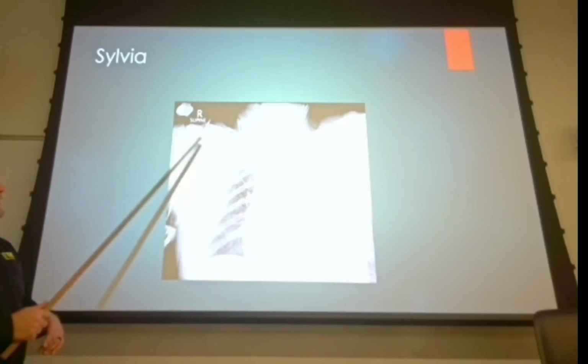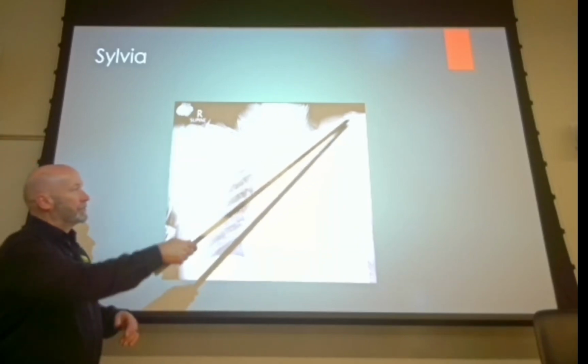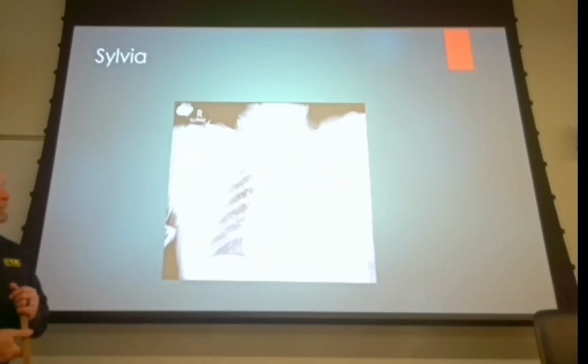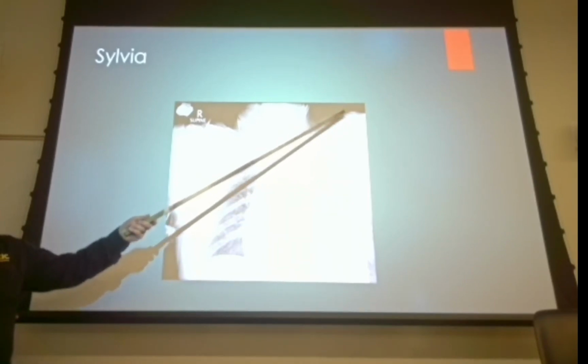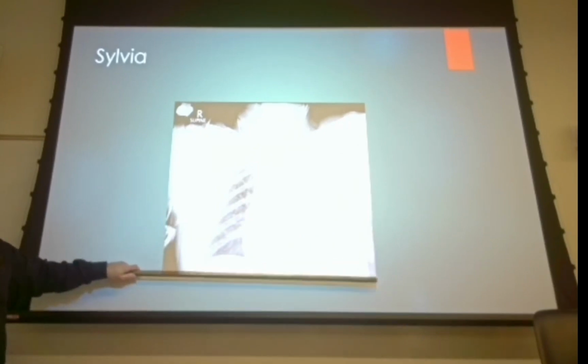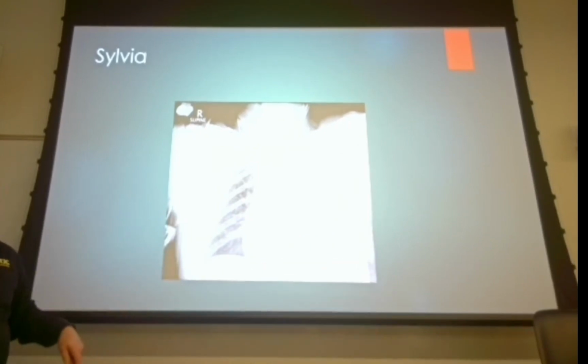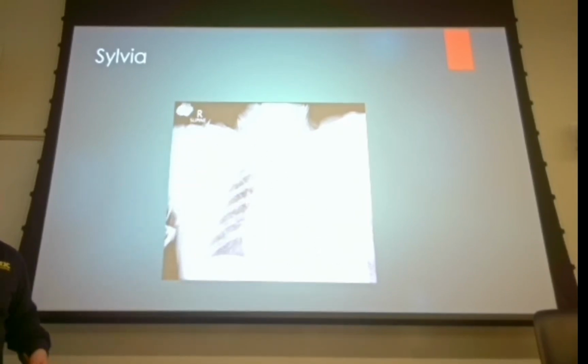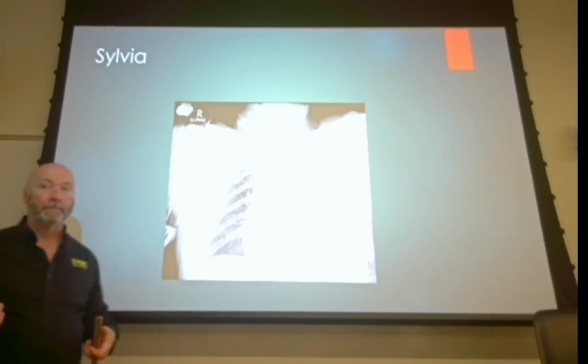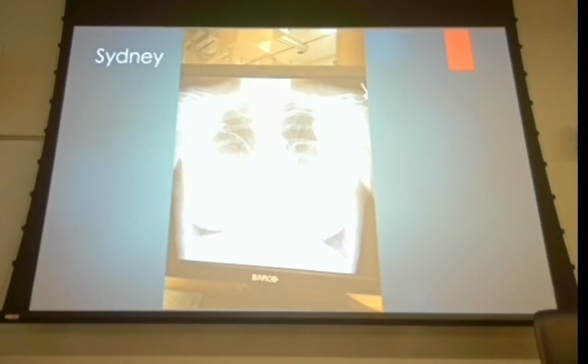So the other thing with having the clavicles, you know, the shoulders up, you get that V-shaped clavicle, is that that's the result in a lot of cases. Because the shoulders are up, then you put the top of the image receptor 1.5 to 2 inches above the outer portion of the shoulder, and what you wind up with is missing the bottom of the lung. So it's important, even if the patient can't sit up and you have to shoot them supine, to get a good idea where the shoulders should be, or where they would be if the patient was upright, okay? And position accordingly, otherwise you're going to miss the costophrenic angles in a lot of cases.